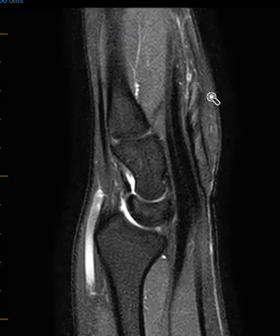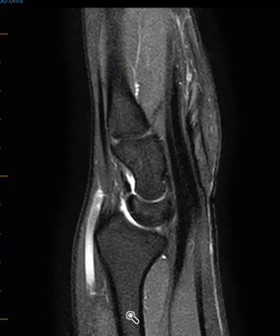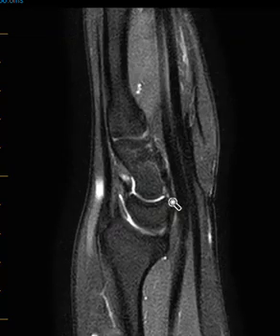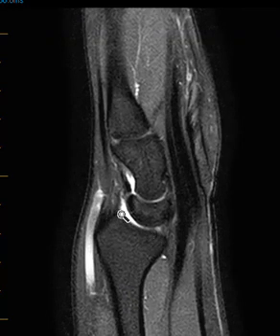Now in a side view, a sagittal view, where we see the distal radius, normally the articular surface is horizontal. Instead, this is tilted towards the palmar direction. Here's the palm. So this is some moderate palmar tilt. And also the long axis of the carpal bones, these are the carpal bones here, and here's the long axis of the radius. So there's palmar subluxation of the carpal bones relative to the radius. And again, that's from the slanting of the distal radial articular surface.